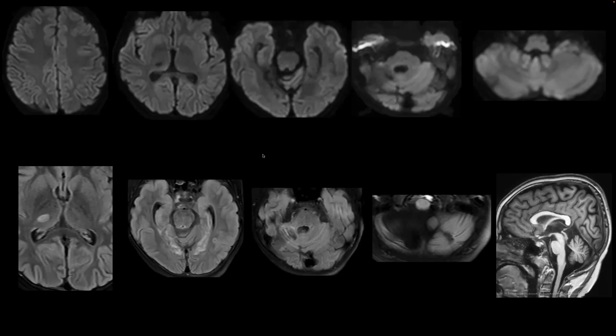Yeah, if you give contrast, it enhances, but the degree of enhancement usually dictates the cause. I would expect some degree of enhancement in the walls, but is it causing significant luminal narrowing? Is it focal? Is it uniformly on both sides? If it's uniform on both sides, then possibly not. Because we had this COVID patient where the enhancement continued for 6 months. Yeah, it's known to continue 6 months normally. So the enhancement should not be taken as a grade of active inflammation.